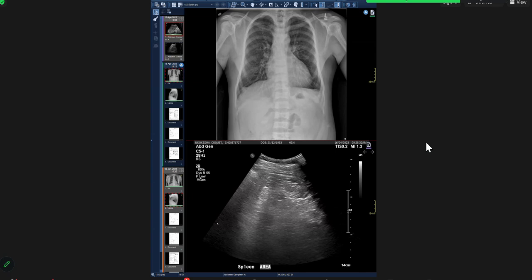Try to look at the other additional findings going to the edge of the film. Everyone should develop a technique, like I would start from here. Once I don't see anything in the lungs, I don't see anything here, then I'd start from here and start to go like this to see if I see anything, like this, like this, and going like this.